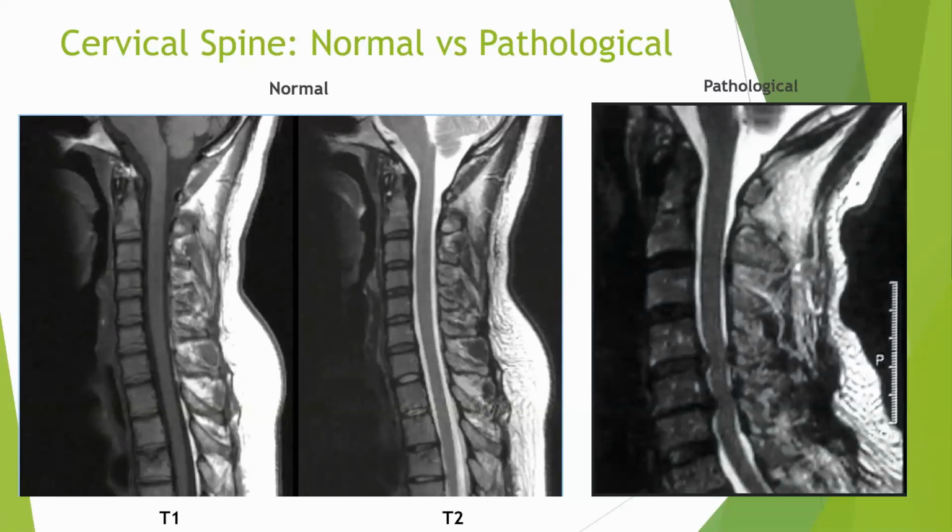Again, from a pathological standpoint, voila, you can notice that there is a lot of disc bulge in here, 2 levels of disc bulge, which actually is compressing the spinal cord, right? As you can very easily notice. What is the other thing that you are noticing? Always look at these facet joints. Look at the facet joints. You are not able to distinguish the facet joints, which makes me feel that there is also for sure facet joint arthropathy.